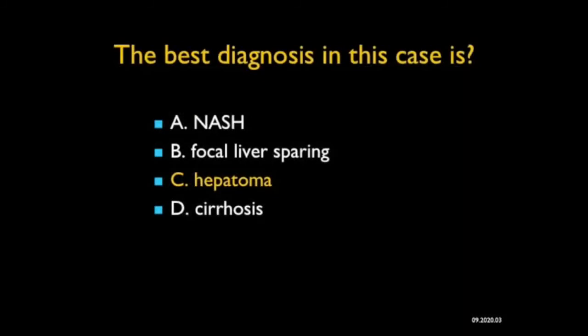Sometimes within fatty liver, it can be confusing. You can miss liver mets. You can miss primary tumors.